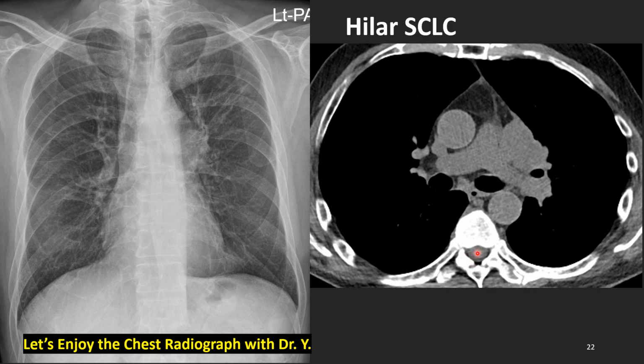Non-contrast axial CT image at the hilum level. What do we see? Normal right pulmonary artery, normal left pulmonary artery. Nothing should be here. If something's here, it's wrong. This is small cell lung cancer at the left hilum. That's why this left hilum is dense, with irregular margin and no demarcation of normal pulmonary vessels, and this linear density is lymphangitic obstruction due to tumor.